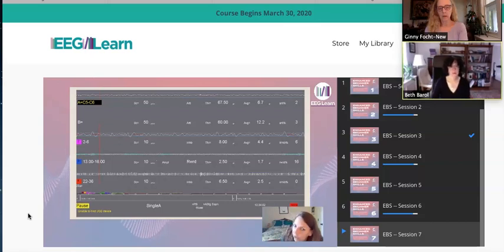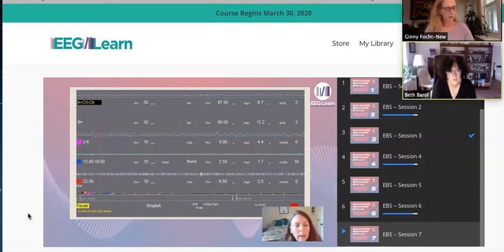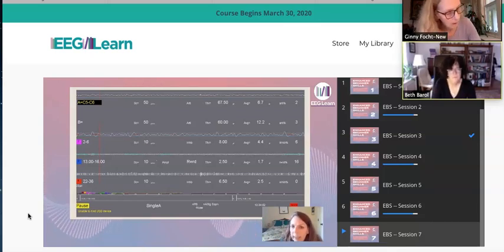This can also illustrate something else we talked about with the F11 key. When you use the F11 key to adjust your thresholds, the lowest the F11 will ever set either of your inhibit bands in microvolts is 6.